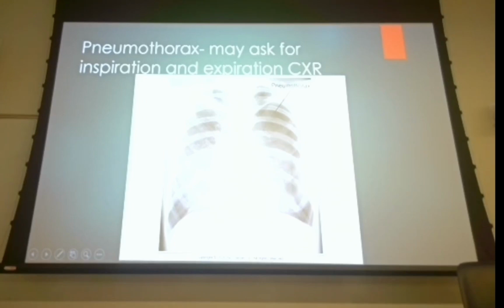Can you kind of make out the edge of the lung here? If you can't, what you can see is a total lack of lung markings out here as opposed to there. Largest pneumothorax I ever saw was a spontaneous pneumothorax, again, in a patient who had kind of a runner's build.